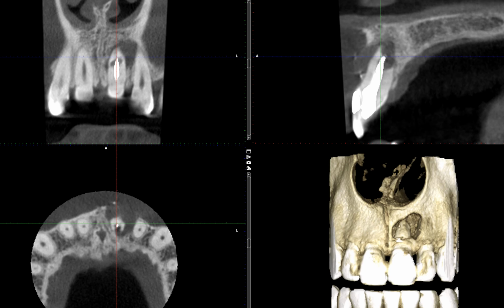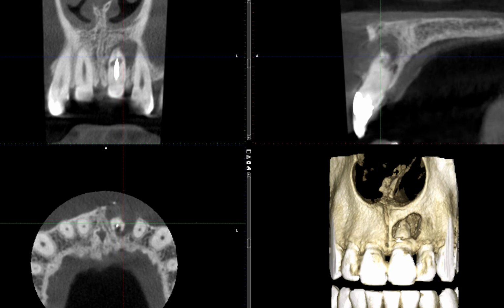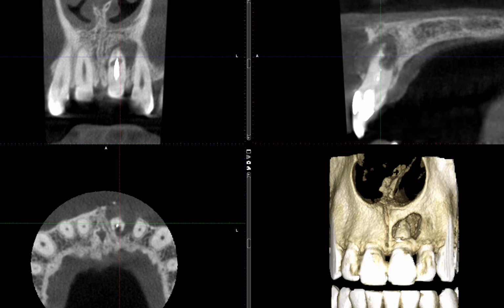Now let's look at the sagittal view. As we have already identified the features from the axial plane, we see somewhat irregular root resorption involving the apical third of this tooth number 9. It's not a smooth resorption, but I'd say it's an irregular root resorption right at the apex. And again, interestingly, there is an expansion of the buccal cortical plate. The plate itself has expanded and significantly thinned, and there's a high probability of this being perforated focally along the buccal area.